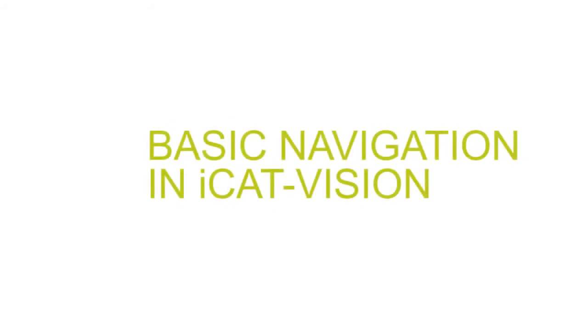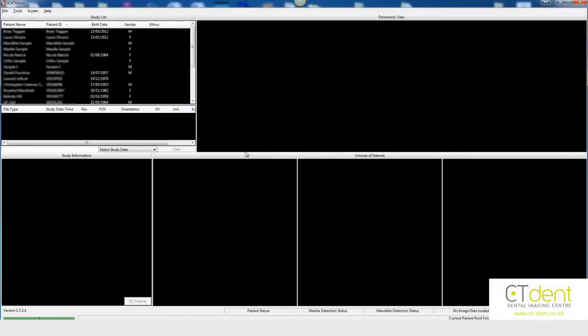This video will guide you through the interactive screens available in the iCAT Vision software. When the software is opened, the preview screen will be shown. This is divided into boxes. Shown in the top left-hand box will be the names of the patients whose data have been stored in the software. When you find your patient's name, click on it.